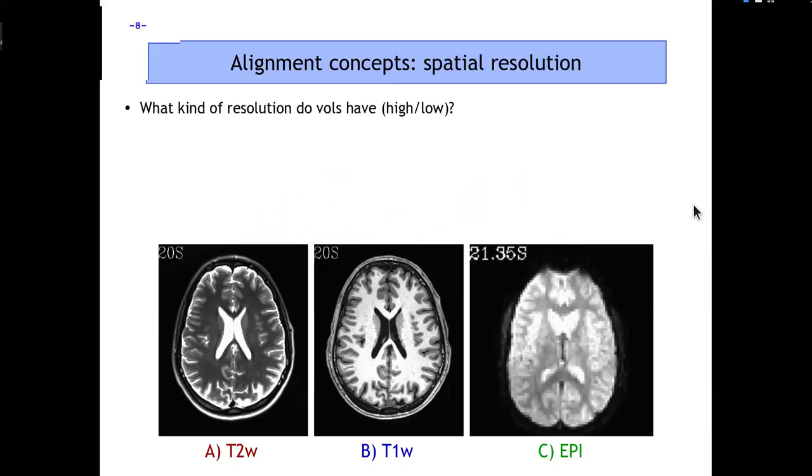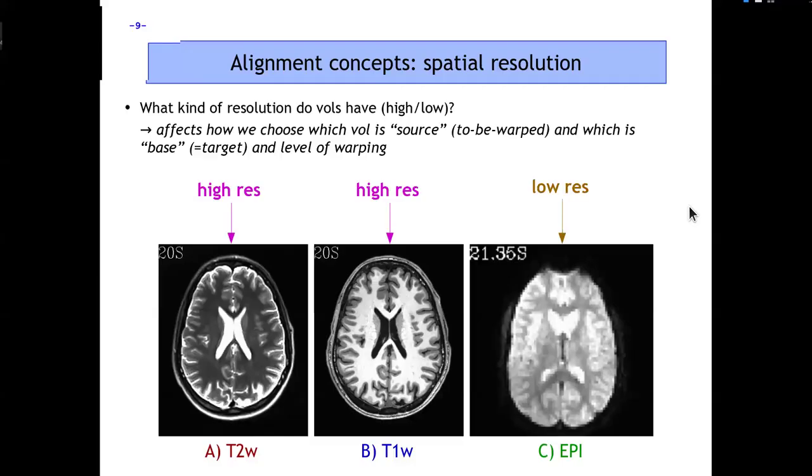And in terms of spatial resolution, another property, which data sets here have high resolution, would you say? This one is probably pretty clear. Literally clear with the higher resolution data sets. We see nice sharp edges, nice sharp features, and the voxel sizes are smaller, so the data looks smoother.